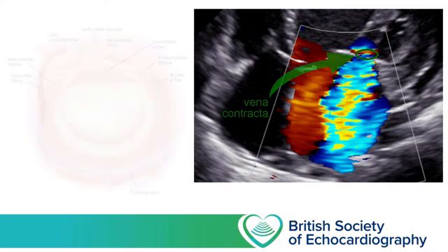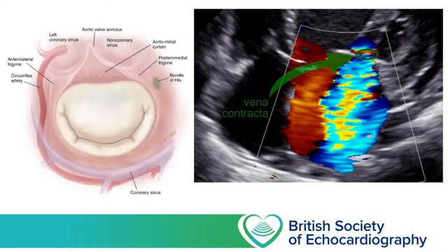So we imagine that the diameter of a vena contracta roughly approximates to the diameter of a regurgitant orifice. But it's important to remember that the orifice may not be perfectly circular, and when it isn't, the angle through which we bisect the orifice is important. If we consider that in the apical 4-chamber we cut obliquely through the leaflets, then the diameter of a vena contracta would be the same, regardless of whether or not our orifice was centred exclusively on the scan plane, or rather extended along the entire coaptation line. Clearly the latter is a much more serious lesion, and will allow far more regurgitant flow.